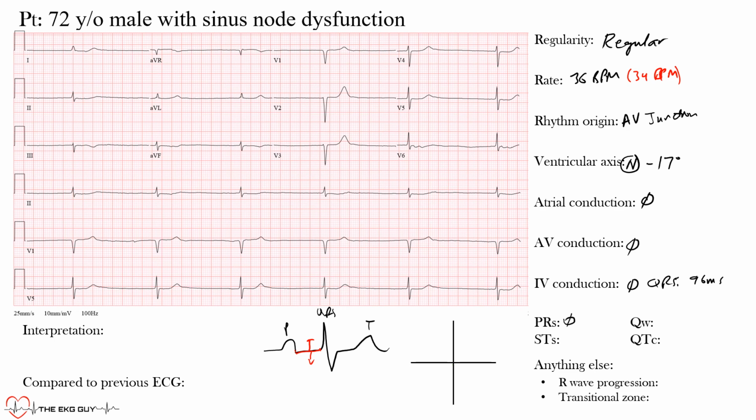Next, we want to look at the QRS complex, and we're looking for any abnormal, pathologic or significant Q waves that may represent a prior infarct, and sometimes an ongoing one, or acute injury. What we see here actually is a Q wave in V1, in V2, and maybe V3. You may see an initial portion that may be a small R wave, but certainly in V1 for sure we see that. So V1 is one that we should keep on. I'm just going to comment on that, plus or minus V2 to V3.